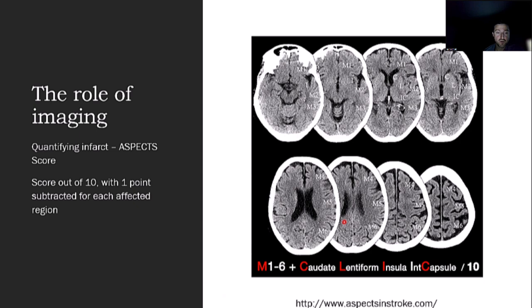It can be slow flow. Certainly you can have cases where you have a significant stenosis more proximally that's not intracranial. So you have to make sure you're looking at all the vessels if you have a severe carotid stenosis or proximal occlusion. That can be one case. Other cases, you get motion, especially if there's bilateral perfusion defects, so you really want to look at the motion maps on perfusion.